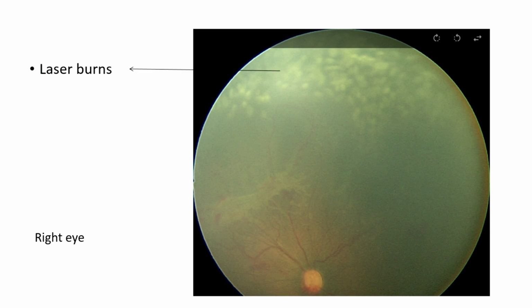Okay. What it's showing is a shunt vessel. Vessels are going to a particular area and then coming back. There are no capillaries within it, so they're just shunting. Blood is just going and shunting. There's no capillary developed here. This is still an avascular area. So this also needs treatment.